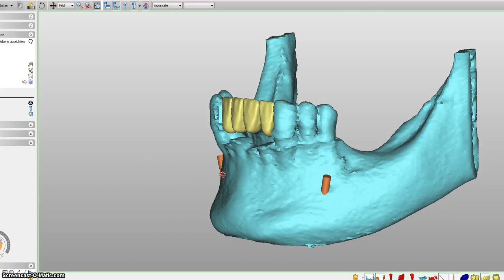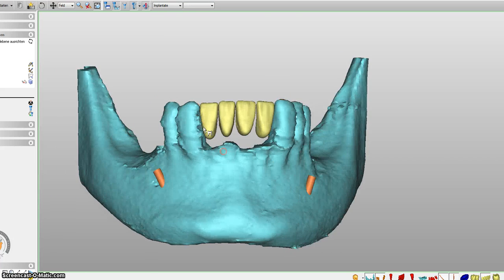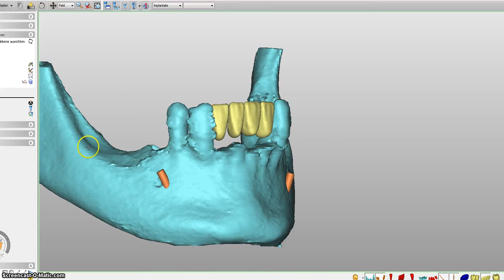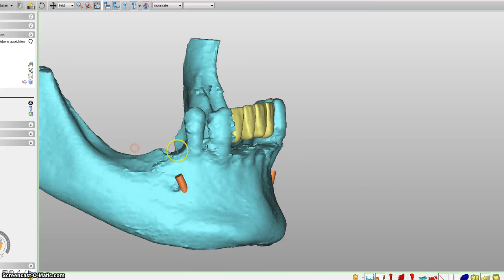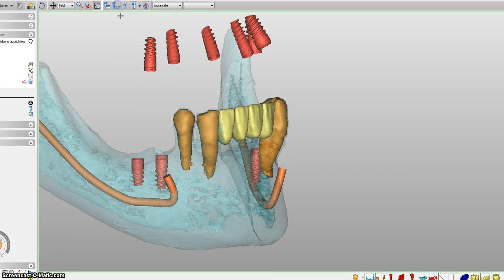This area on your left and on the right side, obviously when you have food inside your mouth, this is the area where you are supposed to chew. So we have to replace these teeth as well. Unfortunately, we cannot create a bridge like here in the front, because we would need another tooth in the back here. But since this is an end situation, okay, there is no more teeth towards the back, I would recommend that we place implants. I'm going to make the bone see-through, and here you can see the implants.